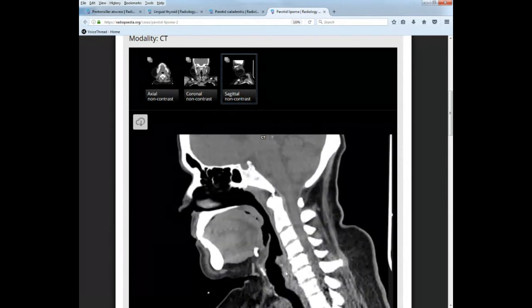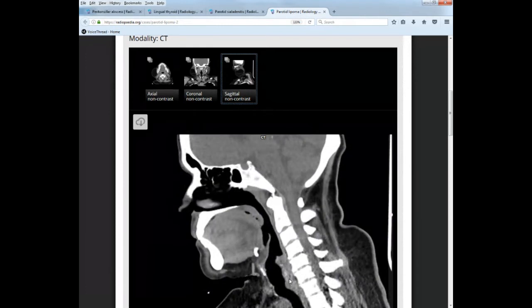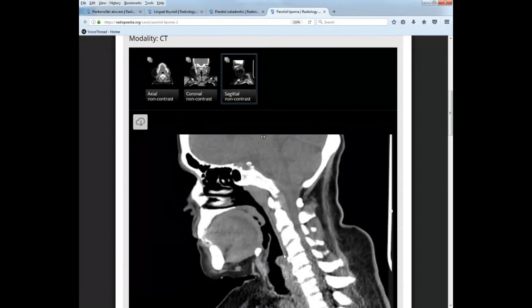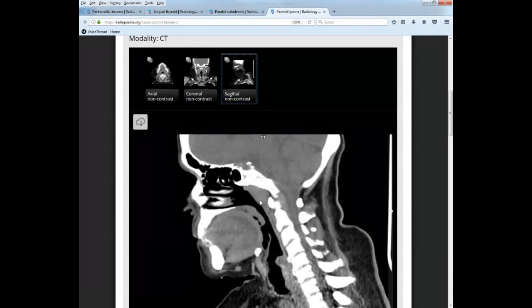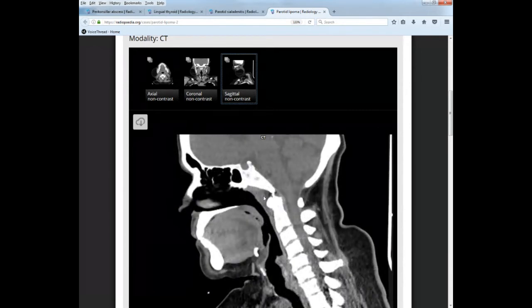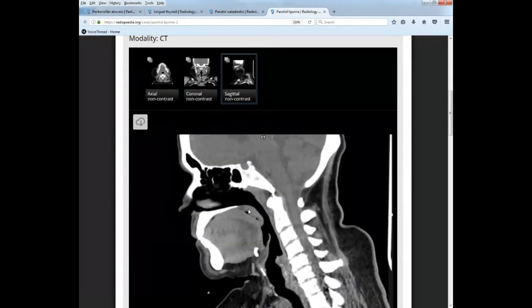This is cricoid coming in the back here. So those are your cartilages, epiglottis, vallecula, piriform sinus back here. Pharyngeal tonsils. Here's your palatine tonsils there. Clivus, hard palate, soft palate.